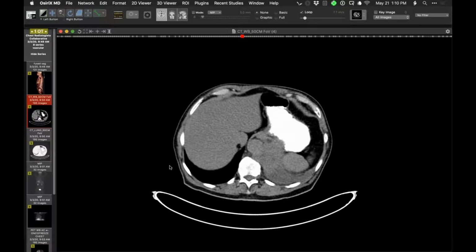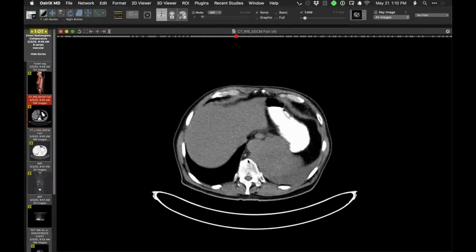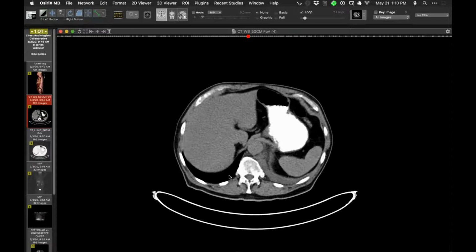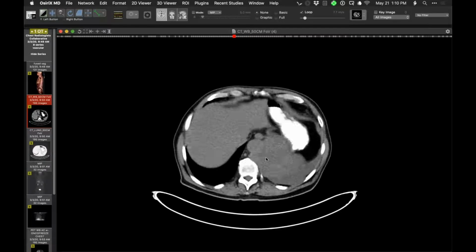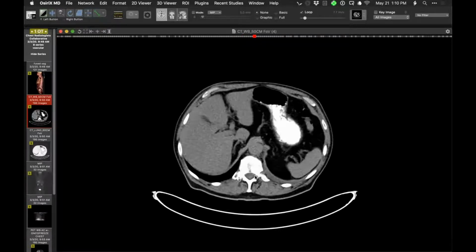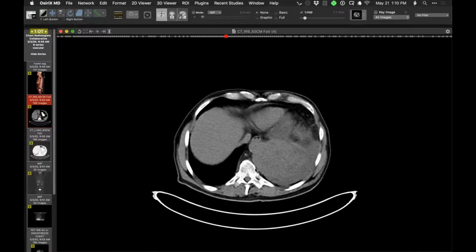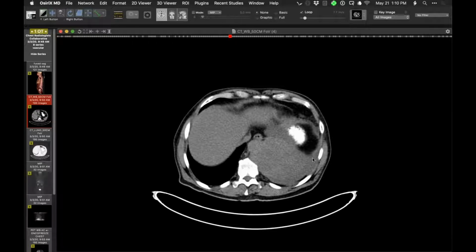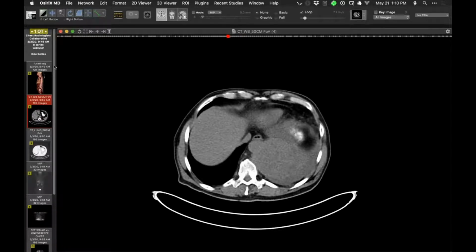And the question is, where exactly is it located? It's obviously contiguous with structures like the aorta and the vertebral body. And I think that at around about here, the mass is lifting up the crus in part and maybe growing primarily in the para-aortic retrocrural space. But obviously it's very large and occupying a substantial volume in that basal hemithorax.